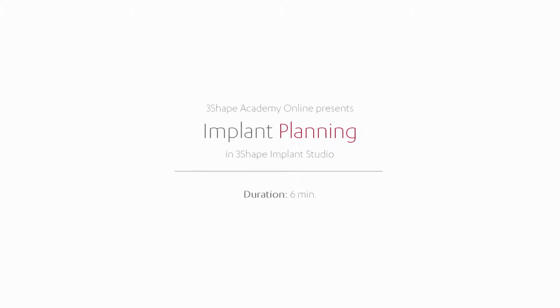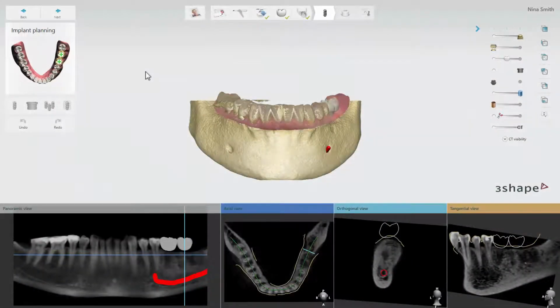In this video we will show you how to plan an implant placement for a tooth-supported implant case in 3Shape Implant Studio. Before this step in the workflow, you have already imported scans and designed the anatomy of the tooth. Please see the previous videos in this series, Tooth-Supported Implant Planning, for more information.